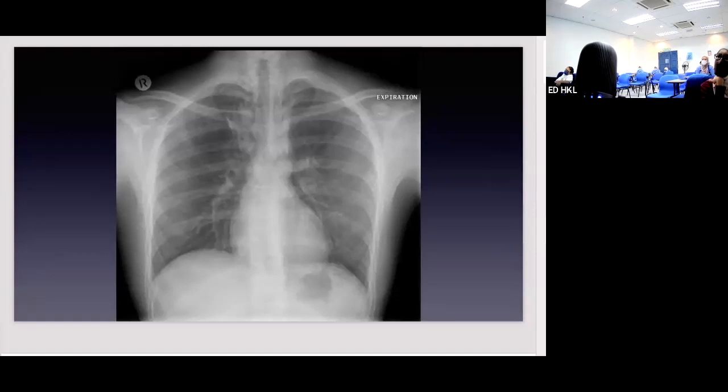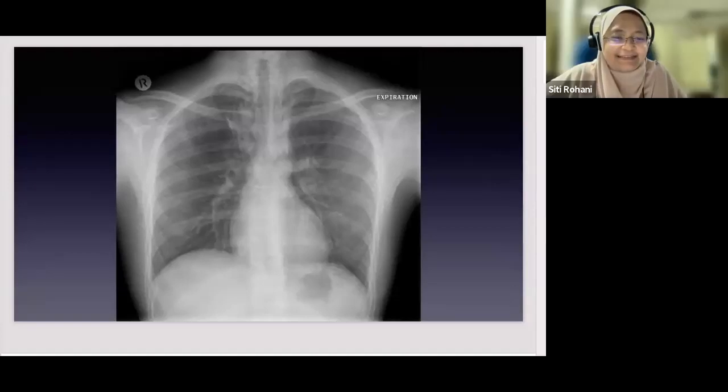Yeah, like pneumonia. Yes. Then you can see the streaky lines lucency at the superior mediastinum, right? Here, with air tracking down the mediastinal border bilaterally. You can see that's air. And this is on the left side. So this is consistent with pneumomediastinum.